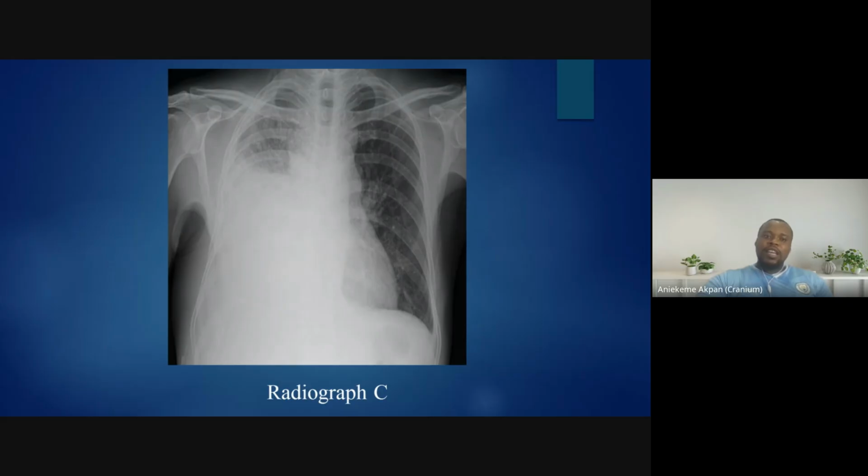So if you see that pleural line, you are also going to look for lung markings. These lung markings are from vessels like pulmonary arteries and pulmonary veins. So if this air is within the thoracic cavity or the pleural cavity, it will not have blood vessels, because air in the pleural cavity is not actually an organ. So you are not going to see those lung markings, those arteries and the rest. Because those markings are not there, together with the pleural line, we can convincingly say that there is pneumothorax.